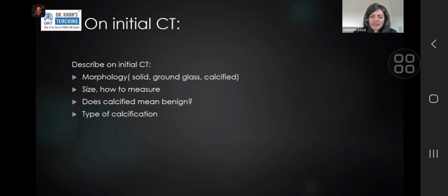So small foci of calcification, you would say that this nodule is partly calcified, suggestive of a benign pathology. However, this could also represent underlying malignancy such as carcinoid or possibly metastasis from what you guys have said, although the primary may be known, may I know the history. So like I said, calcified doesn't always mean benign, but fat means benign.